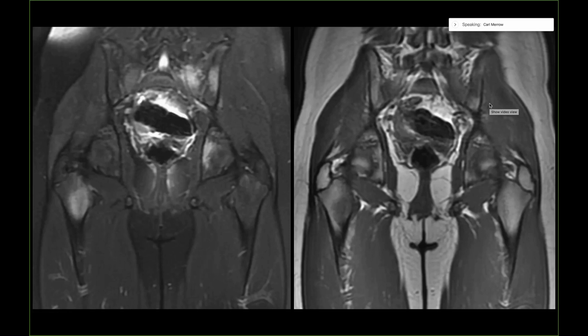Now, what I would like to have seen that maybe would have made the case a little stronger was, I really like it when there's sort of symmetry across a physis. Like sometimes you'll see equal parts, like greater trochanter and directly adjacent metaphysis involved, or on either side of the triradiate cartilage. Sometimes they'll be relatively symmetric from side to side, like right, left. And we didn't really have either of those things here. Nevertheless, I really thought that that's what it was going to be.